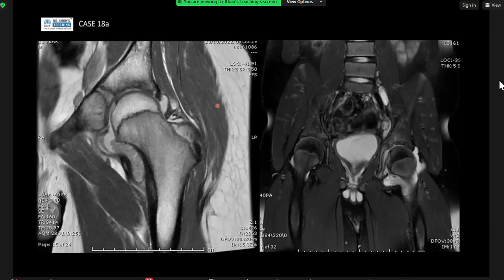People can still go on. They can still carry on. They are not in excruciating pain. So it can be grumbling for quite a while, and then it's incidentally picked up. So it's this synovial proliferation that's quite marked, and the absence of marrow edema. Often in septic arthritis, there will be some extent of marrow edema, and of course, prolonging it without treatment, you start to get more in the way of bony destruction because of the inflammatory process.